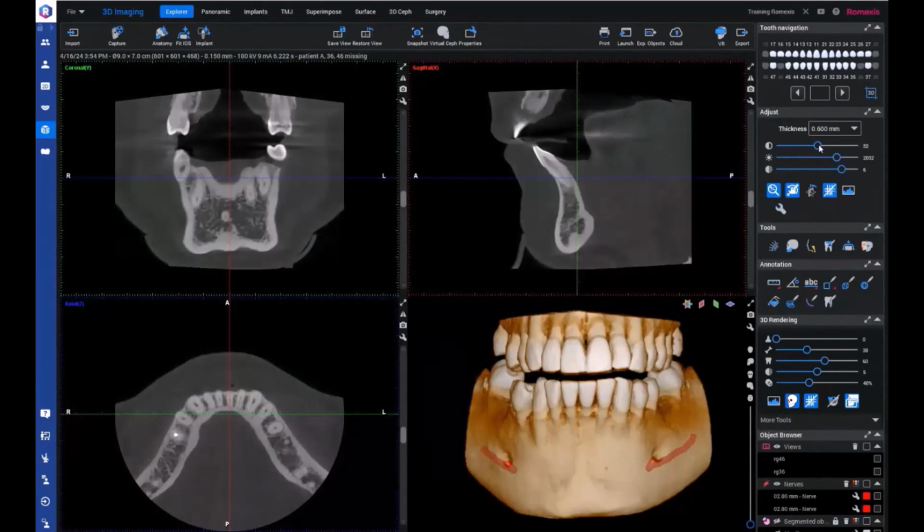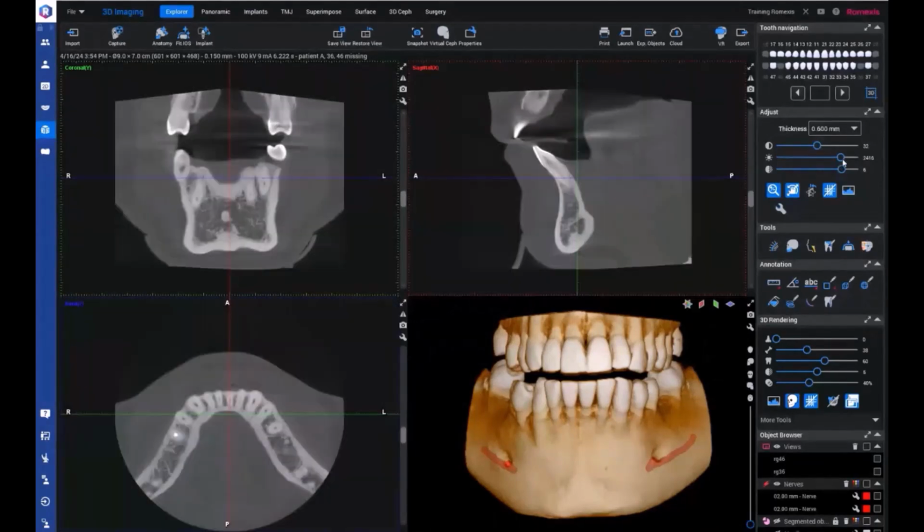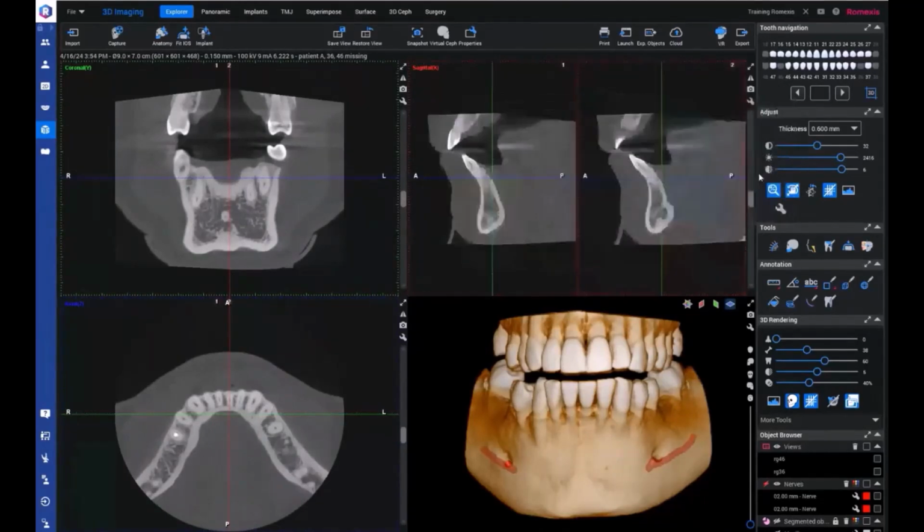And then for example, if we want to adjust some of the slice view settings, if we want to see more slices in some of these views, that can be done from each view, with this wrench icon that we have there. So you can add multiple slice views, for example.